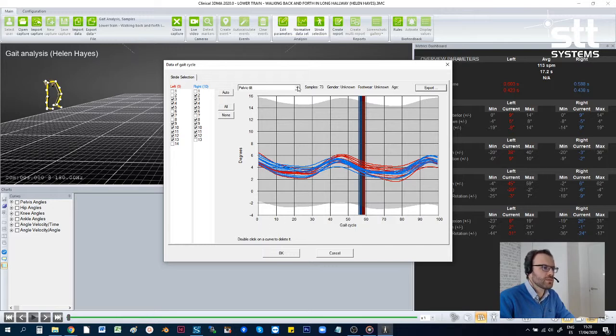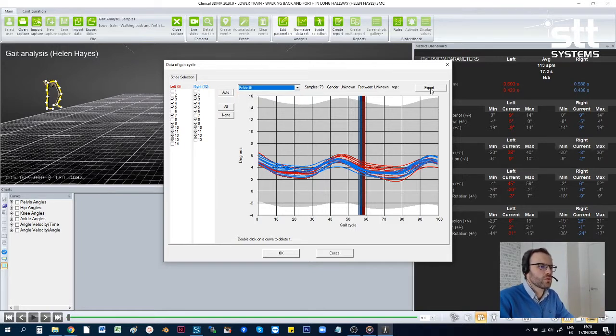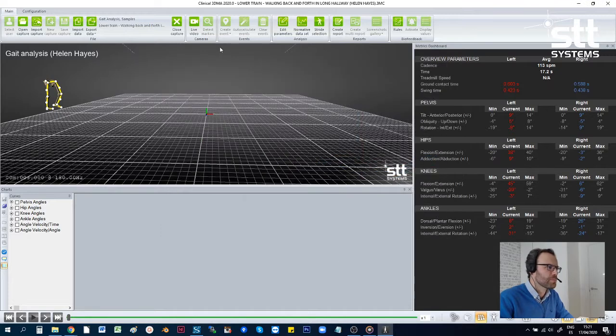So you will end up in this case with 12 or 13 curves multiplied by 2, that's the number of CSV files, and each file containing as many columns as curves in here. I don't want to do it because it shows a lot of files and it's a little bit messy.